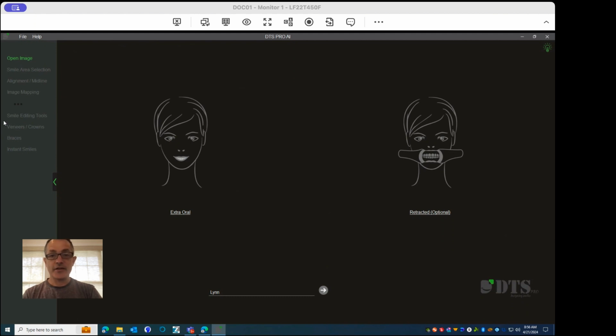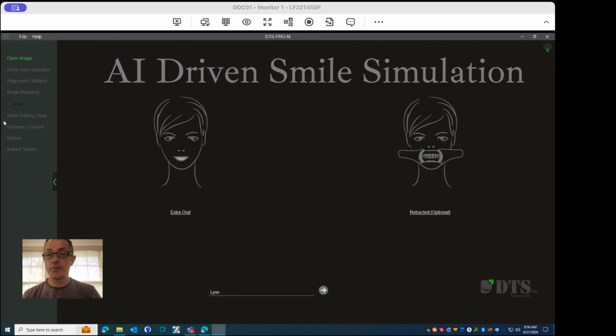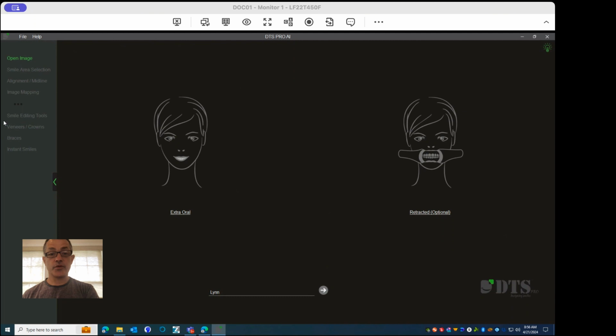Hi, I'm Dr. Erik, and I wanted to show my potential patients and fellow colleagues how I use this super cool software called DTS Pro AI Smile Simulation Software. First thing I'm going to do is click on Extra Oral Image.